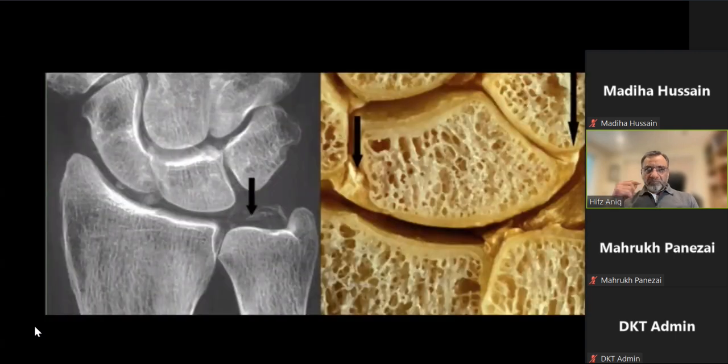So, where does it calcify? Calcification is in the TFC and in the ligaments and also surrounding soft tissues. This slide is from Resnick's, I copied that. So you can see the calcification. It can be very faint. It can be in the cartilage. Can you see that? The cartilage is calcified in the lunate and triquetral bone. And there's also calcification in the scapholunate ligament, which is here.